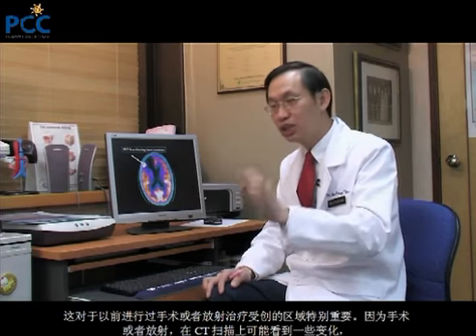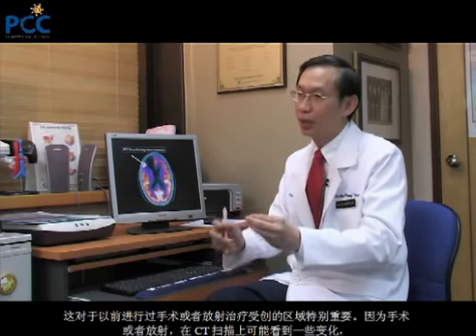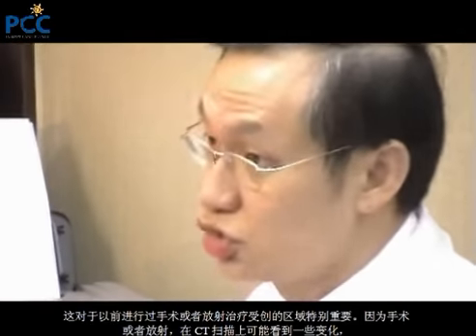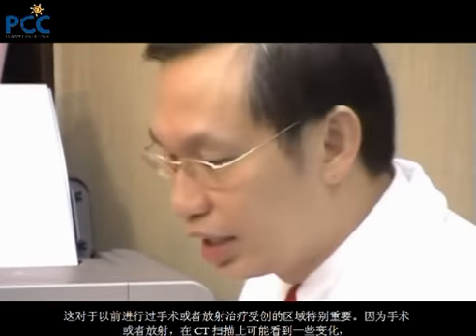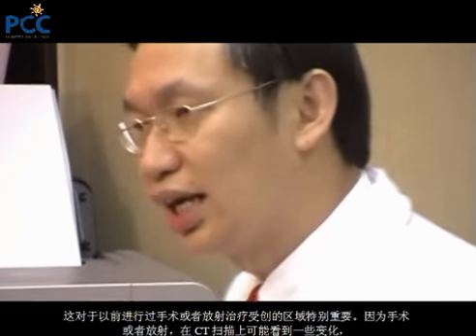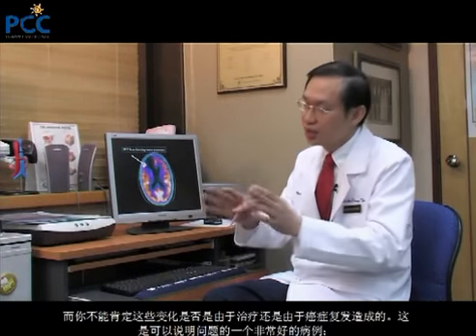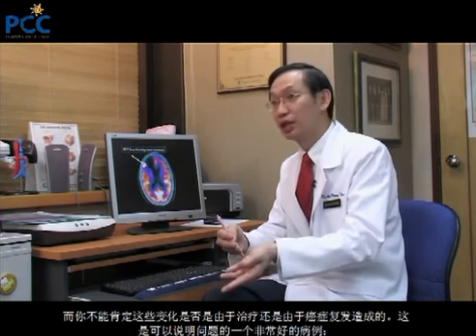This is especially important in an area whereby it may be scarred from your previous surgery or previous radiation. Because of the surgery and or the radiation, there may be some changes that are seen on a CT scan where you cannot be certain whether these changes are really due to your treatment or due to cancer recurrence.